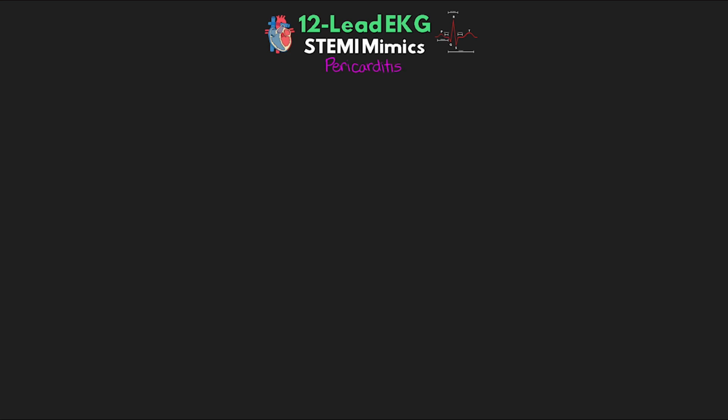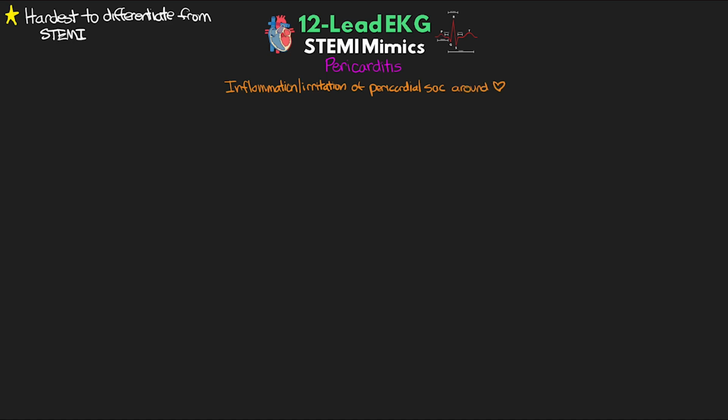Alright, and then finally for the last of our STEMI mimics, we're going to talk about probably the hardest one sometimes to differentiate from STEMI, and that's going to be pericarditis. Oftentimes, pericarditis is actually misdiagnosed as STEMI, as well as STEMI being misdiagnosed as pericarditis. Now, the discussion of pericarditis definitely warrants its own future lesson, but essentially here we have inflammation and irritation of the pericardial sac that's surrounding the heart. So pericarditis can actually lead to profound ST elevation across our EKG, and in later stages T-wave inversion, which can complicate this diagnosis. So how do we differentiate between pericarditis and STEMI?